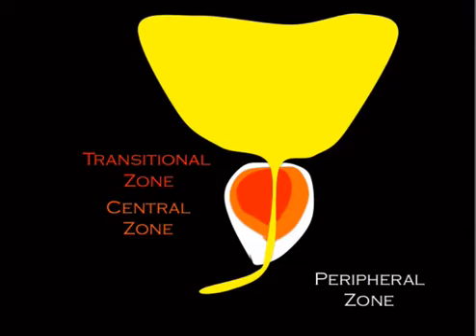The urethra runs through the middle, and you'll be able to see that sort of as the little tiny central donut kind of looking thing at all the cuts. Now here's where the trickery starts.